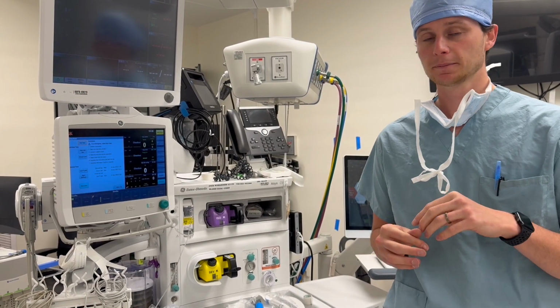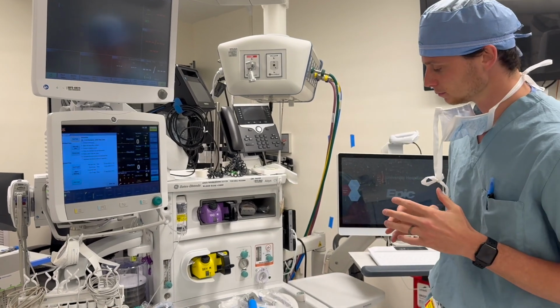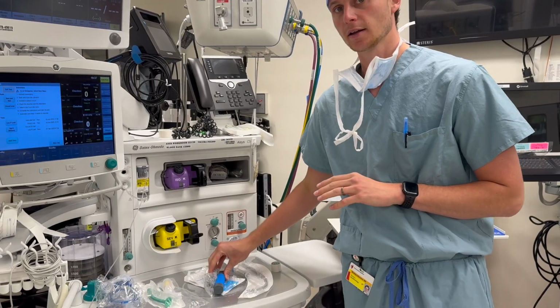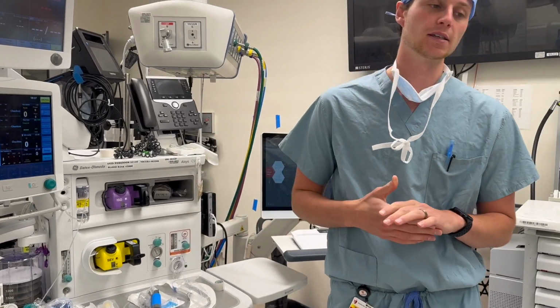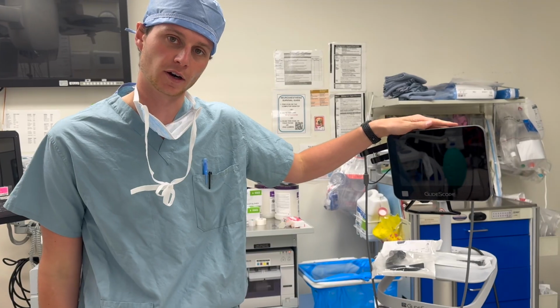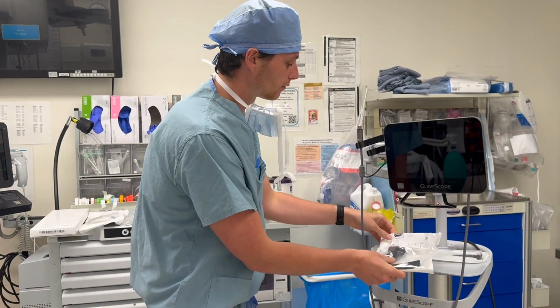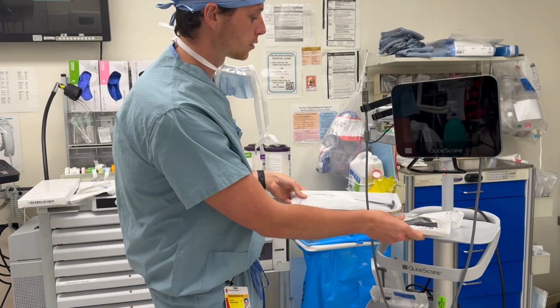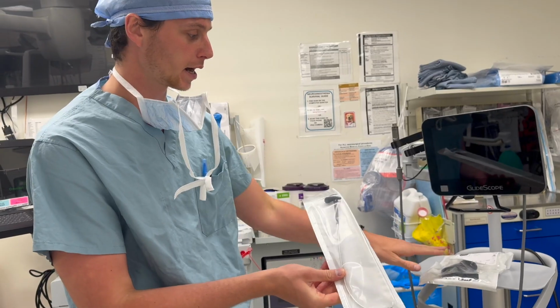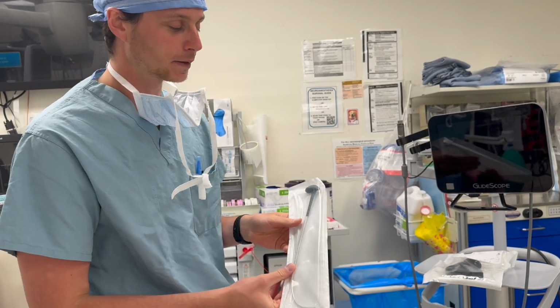When it gets to the airway, it's typically a little different. Because we have an abnormal airway most of the time, I still like to have a DL blade available and ready to go. That being said, a lot of our ENT attendings and ENT surgeons prefer if we use a video scope. This traditional GlideScope is the preferred video laryngoscopy that we use on ENT. We have different sized blades in here, and it also comes with metal stylets that align with the curve of the blade.